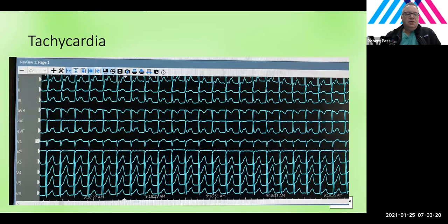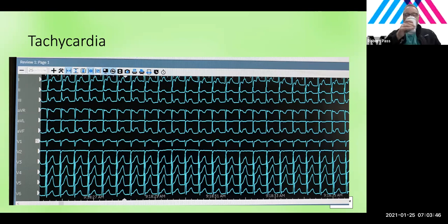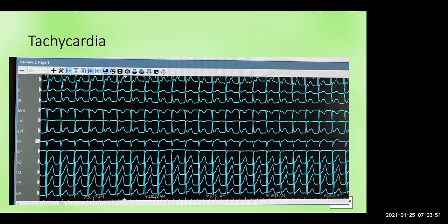Okay, so during catheter placement, the patient had SVT. And this is an example of the SVT. So, David, if you saw this as the patient's SVT, tell me what you see and what you think about it. It's hard for you to tell what the heart rate is. I will tell you the heart rate in this tachycardia is about 150, just as an FYI. What's the age of the patient? Patient is 17.